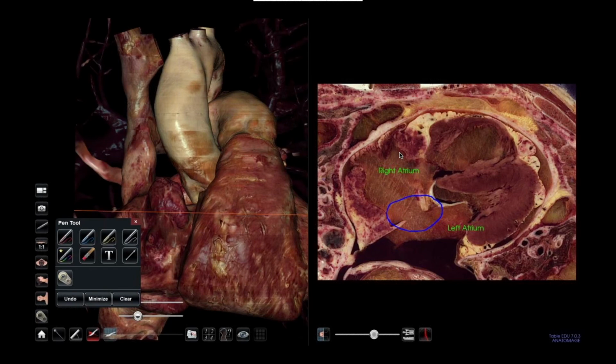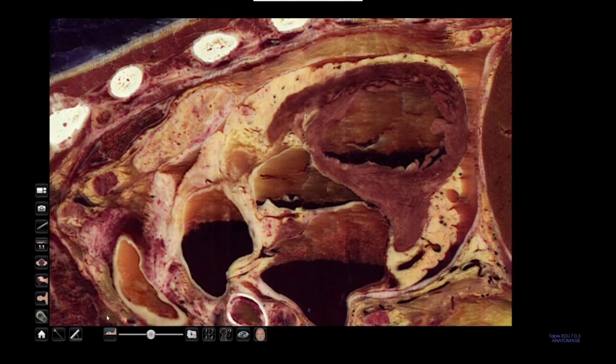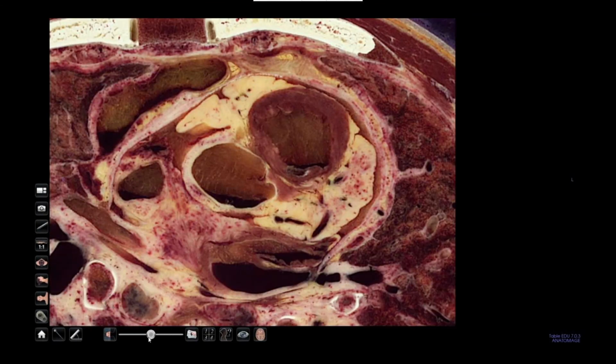So in this case, I will, for example, open one of the DICOMs present inside the table. So let's open only the 2D visualization, and let's change the type of cut. We'll go back to the actual view.